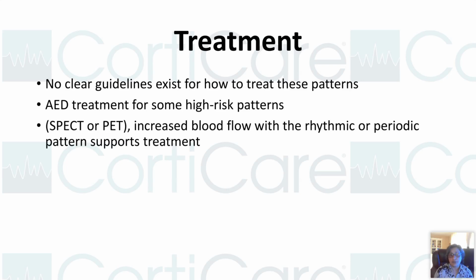And of course, imaging studies like SPECT and PET can help, giving an idea that there is increased blood flow, hyperperfusion, and increased metabolic activity in those areas. So that could be an epileptogenic zone, from which these LPDs can evolve into status epilepticus. So as of now, no clear guidelines exist to treat these patterns.